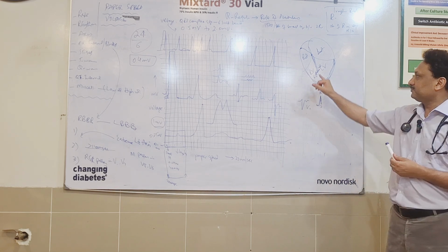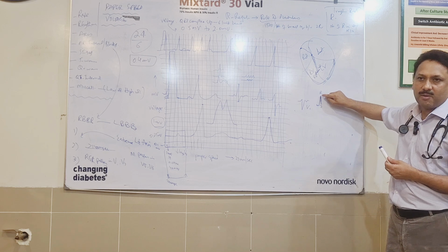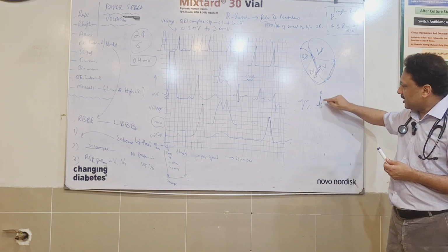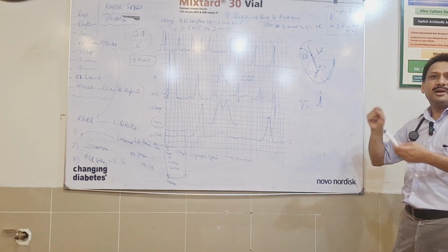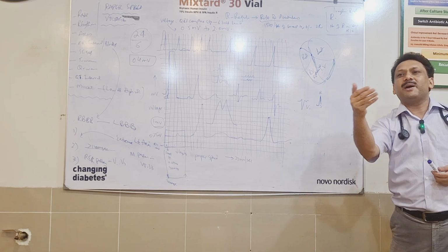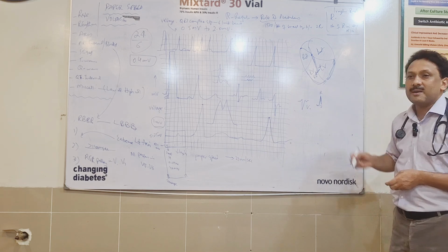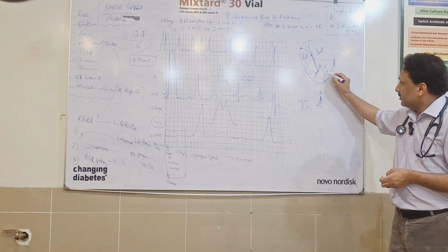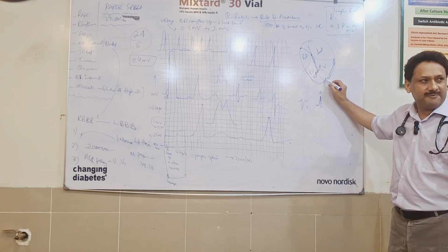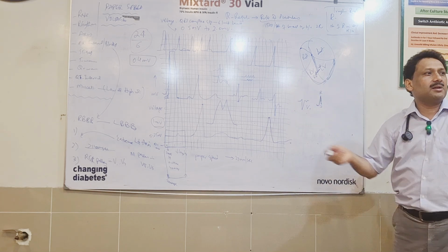What is happening here? The left ventricle contracted, and it resulted in a waveform. Then there was repolarization, it was settling, it was coming down. Repolarization comes after a while, and that is depicted by the T wave. As it was coming down to the baseline, what happened? As it reached that point, through the Purkinje fibers of the left ventricle, the current was dissipated to the right ventricle.